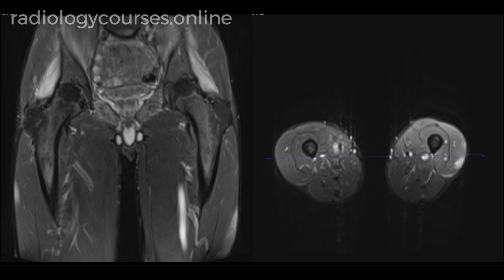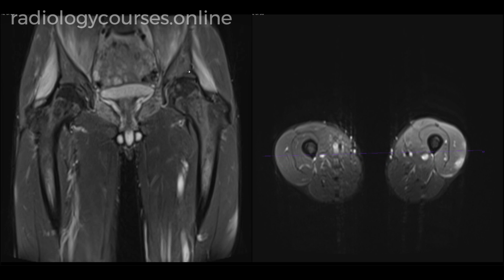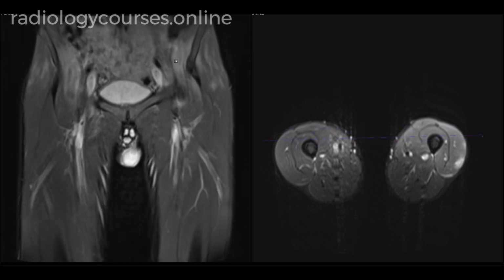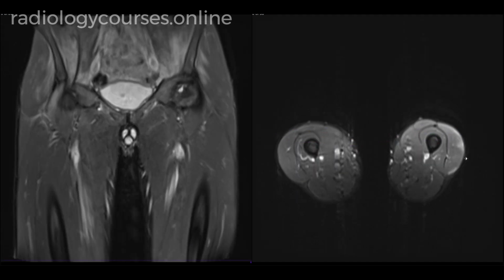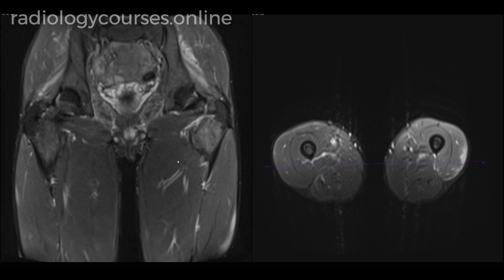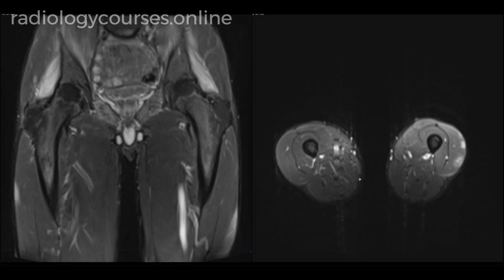So what we have got here is bilateral symmetrical diffuse increase in the signal in bilateral gluteus minimus muscles and also in the iliacus muscles bilaterally, fairly symmetrically. There is also bilateral asymmetric abnormal signal in the superficial aspect of the vastus lateralis muscles bilaterally. The findings are consistent with acute myositis.